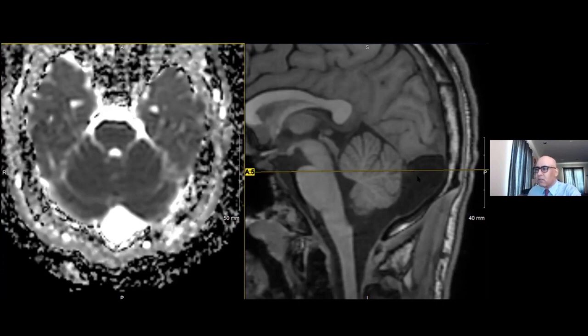It's an arachnoid cyst behind the cerebellar vermis, so it's known as a retrovermian arachnoid cyst. This is normal. This is not a Dandy-Walker spectrum malformation. This does not require imaging follow-up. This does not require neurosurgical consultation. This does not require consternation on the part of the clinical team. This does not require anxiety on the part of the patient. This is a normal finding.